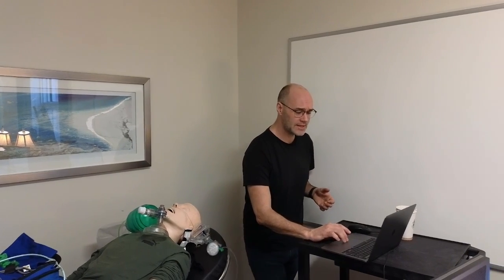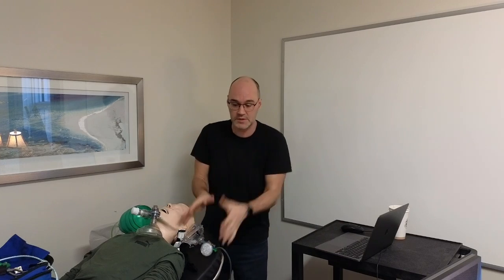Now, who does this particularly help? The evidence points very clearly to two patients that this works really well for, specifically with CPAP. And there would be some crossover with BiPAP. But with CPAP, who really benefits from this is the COPD patient that's got an escalating end-tidal CO2, but is still fully alert. That patient has responded really well, and there's lots of evidence to support the use of CPAP in the patient.